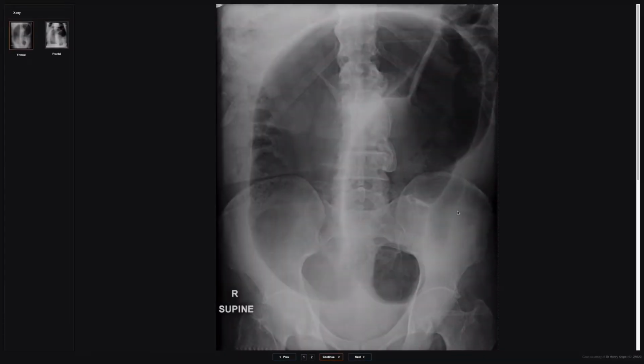Now, that large bowel obstruction was because of a stenosing tumour of the mid-descending colon. So that's where there was an abrupt transition. There are two specific other patterns of large bowel obstruction you need to know about, the two different types of volvulus. Okay, so the first one is a sigmoid volvulus.